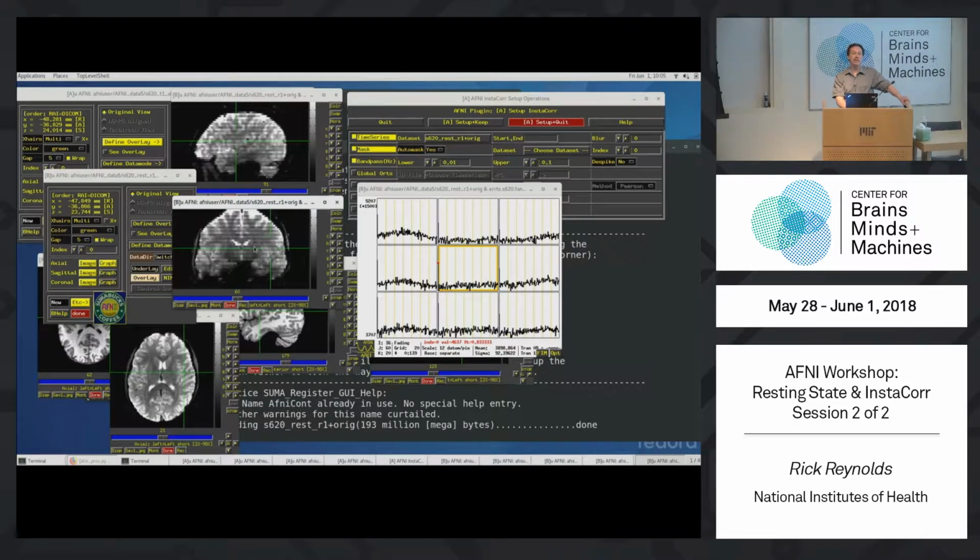The pre-magnetization steady state effect is more clear in these views because you see it between even and odd slices. For motion, it's different. For motion, the subject is moving differentially over space, so you'll see a Venetian blind effect there too, but that's slightly different, unless there's an inflow artifact that you want to talk about. But anyway.